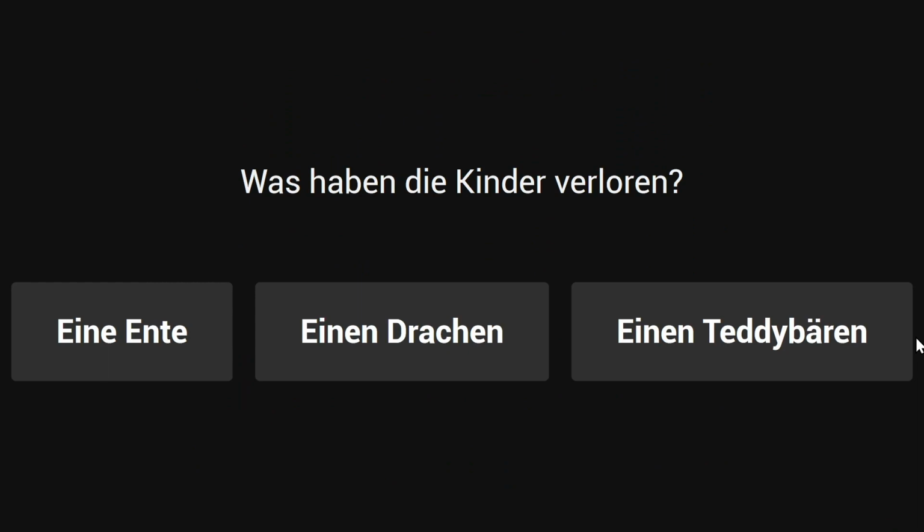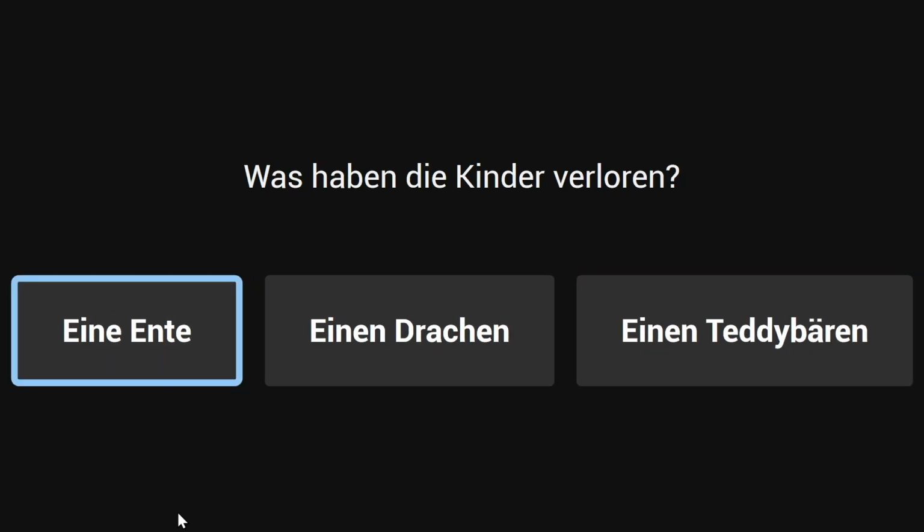Okay. What did the kids lose? And then a dragon, a teddy bear, or a duck. And then you can select the answer. So also reading comprehension might be interesting to take a look at as a test. So you can choose, test whatever you like and play around with that as well as a flow. So as I said, you can be really creative.